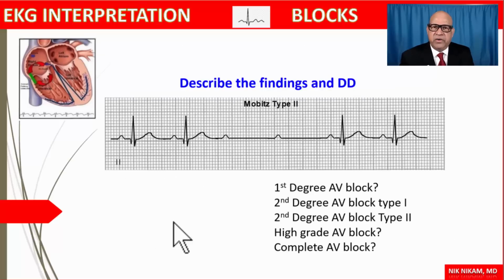Next, what is your diagnosis? You already have a little tip here. Is this first degree AV block? Is this second degree AV block type 1 or type 2? Is this high grade AV block, or is this complete AV block? Let's look at the differential diagnosis here.